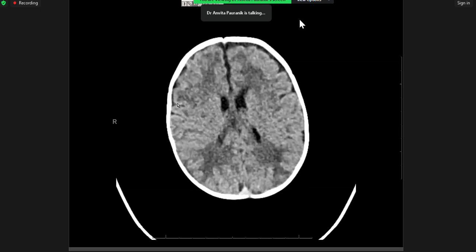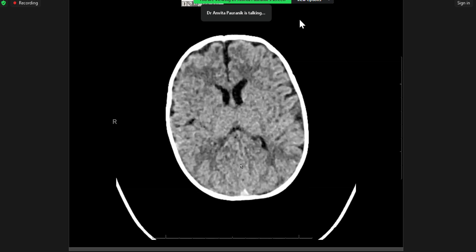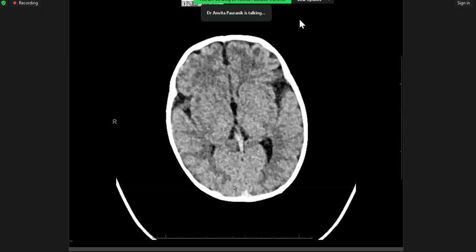Okay, so so far we were debating about this high density. So how do we dissect it? Is this normal or abnormal? People can type in the chat, and I see a first response by Reena, and you can maybe help Rushabh or you can confuse Rushabh by typing in your responses. Rushabh and Joey, it will be your discretion to use help from the audience, whether that help is useful or distracting to you. So let's see if we have more comments in the chat.